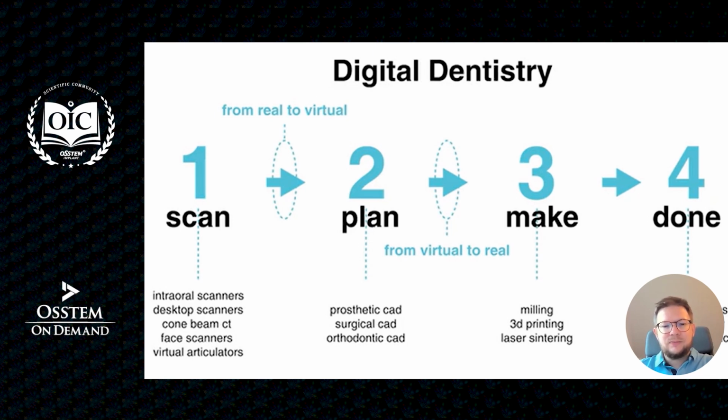First, we acquire data from intraoral scanners or CBCT, and we can add additional scans of the face or the articulator outcome, and then we put all of that data into the virtual environment, and we deal with the software to analyze the case, to plan the treatment, choose the best option, and if we have it done, we can, with the software, produce some devices which will help us to make the surgery guided.